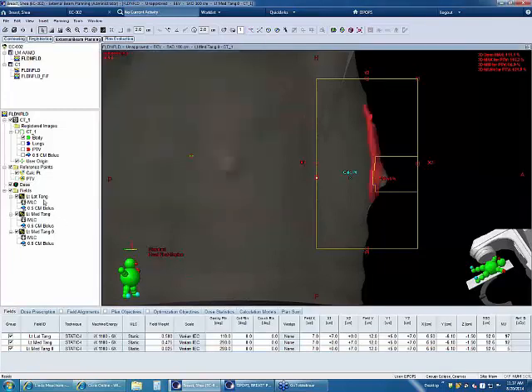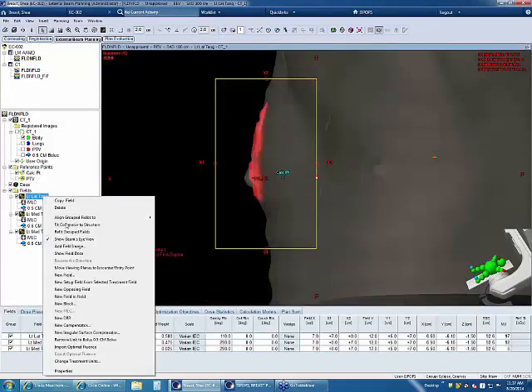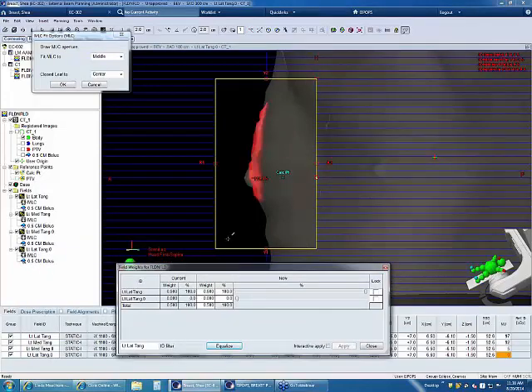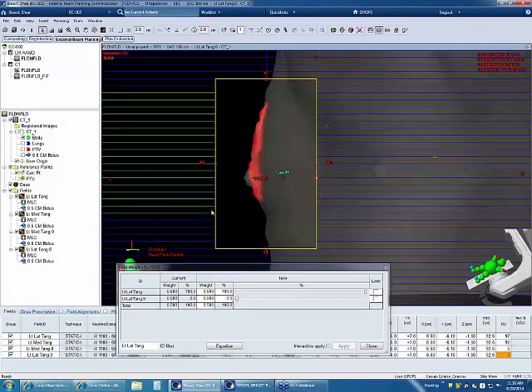All right. This time I'll go to my lateral tangent, and I can right-click and say New Field in Field. And down here it now says left lateral tangent dot 0. Let me move this out of the way. And again, I'm going to take the drawing tool off. This stays sticky for me. I'm going to come up and highlight my first leaf that might move, hold my Shift key down and the last leaf, and now I can draw.